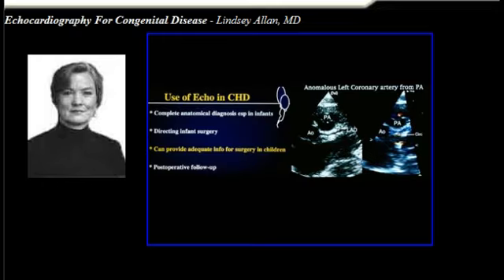But when we looked at the aorta in short axis, here's what looks like an absolutely normal left main coronary artery arising from the aorta, and it seems to breach the wall of the aorta at this point here. So it looks like a normally arising left coronary artery. The clue to the fact that it is in fact arising from the pulmonary artery is the direction of flow within it. The direction of flow in this coronary artery is the reverse of what you would normally expect, and that suggests that it is in fact arising from the pulmonary artery.